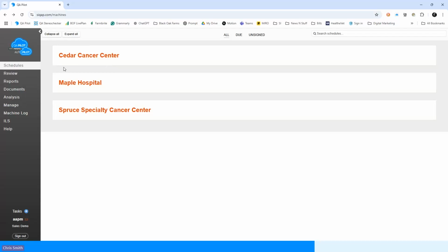As the chair of my department, I need to make sure that all of my clinics are executing the right way. I may be able to see all of these separate clinics. Also, if I need to sign off on multiple clinics, I can do that too on any sort of reports. So that's our first view.